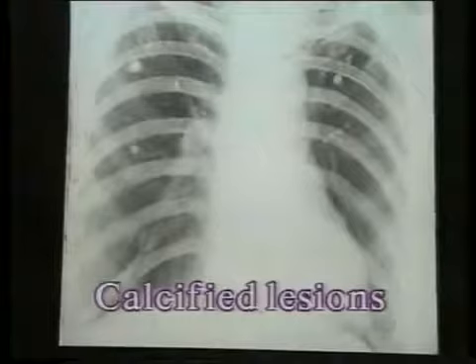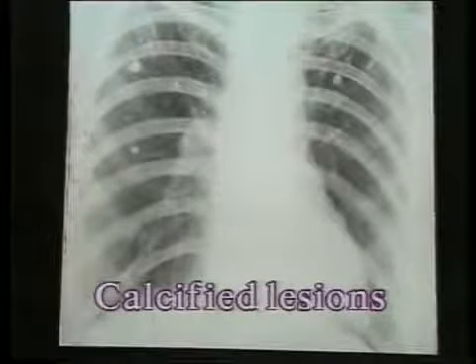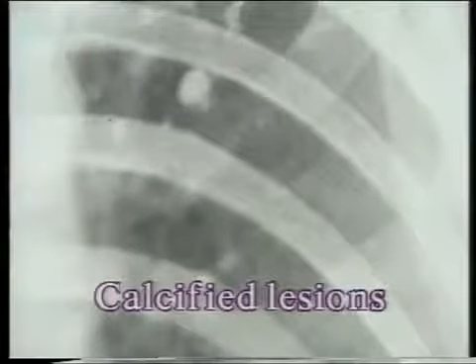Healing in tuberculosis occurs by fibrosis and calcification, so healed lesions leave their marks in the form of fibrosis or calcified spots. This X-ray shows calcifications in both lungs. Note the density of these lesions. They are denser than the bones. These are calcifications in old tuberculous lesions.